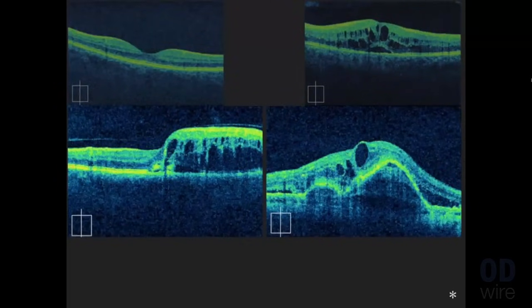Here, you've got an example of two different cases. On the left, a case of a retinal vein occlusion, and on the right, a case of wet AMD. If you're able to know that with diagnostic certainty by simply looking at the OCT, meaning on the left, the patient with the retinal vein occlusion, looking at the diffuse outer retinal thickening and that spread of intraretinal fluid, and you know that on the right, you've got this patient with pigment epithelial detachment, subretinal hyperreflective material, subretinal fluid, and intraretinal fluid, you know that constellation of signs is indicative of wet AMD.